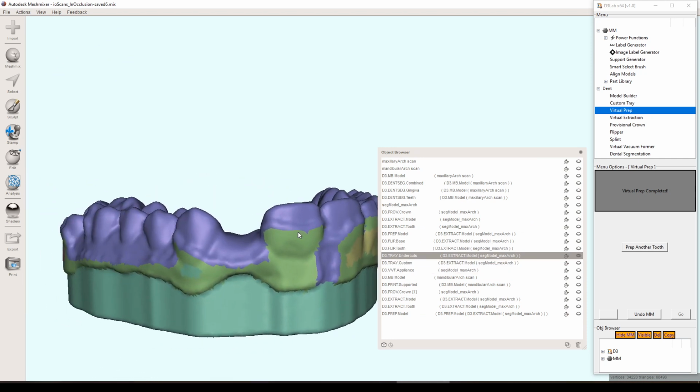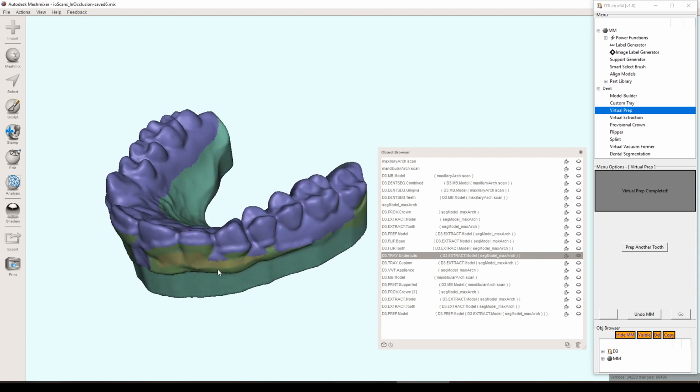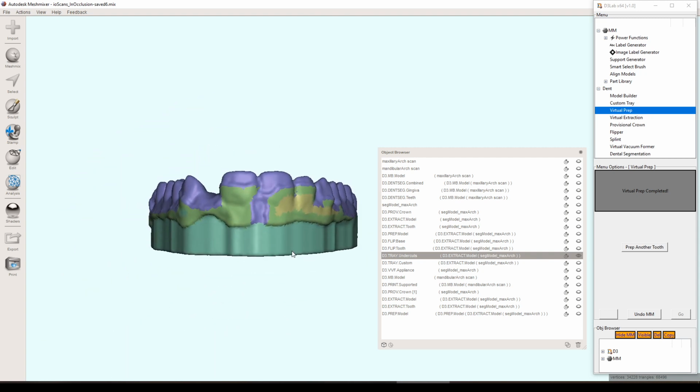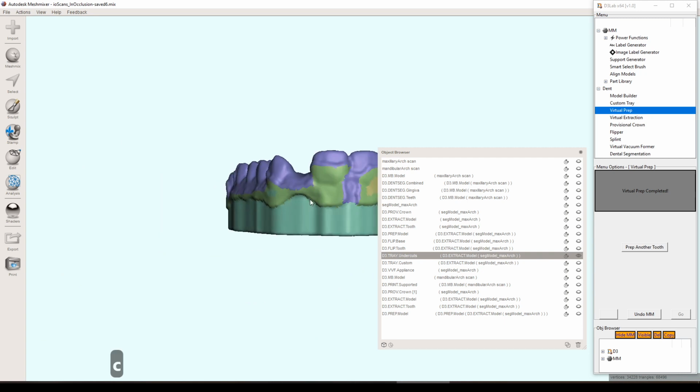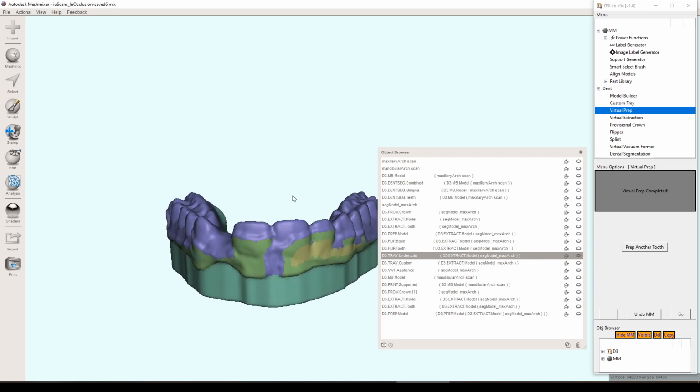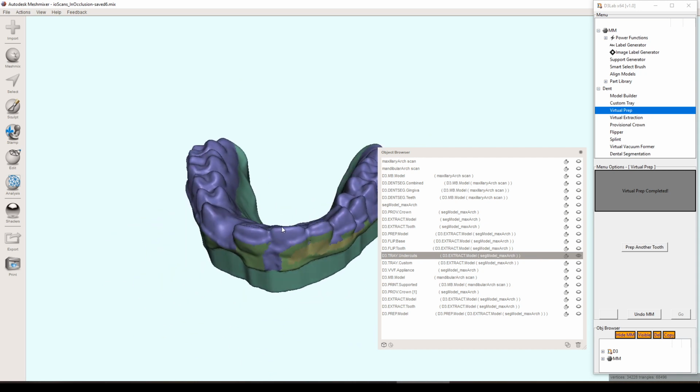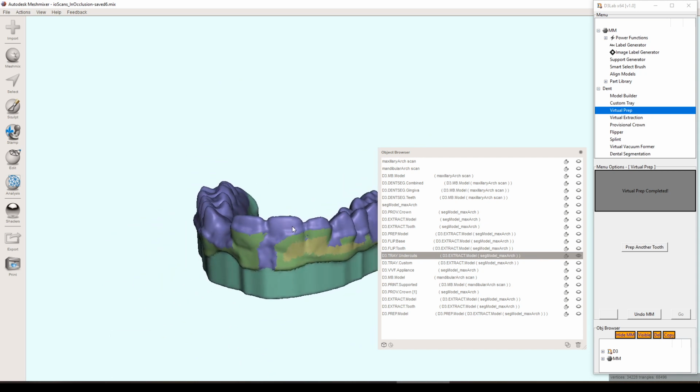So if you want to use that, like I said, for refractory or something like that, or just for a different tool later on, it keeps that model instead of just deleting it. I'm not sure if that's going to be helpful or not, but I figured, hey, let's keep it in there. But the undercuts, it's a little bit different now.